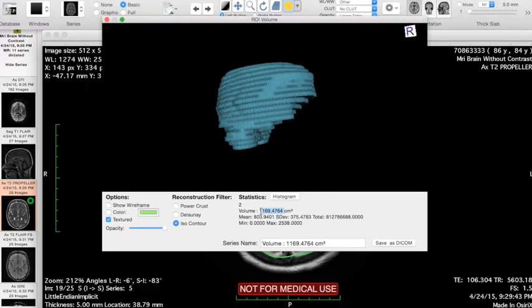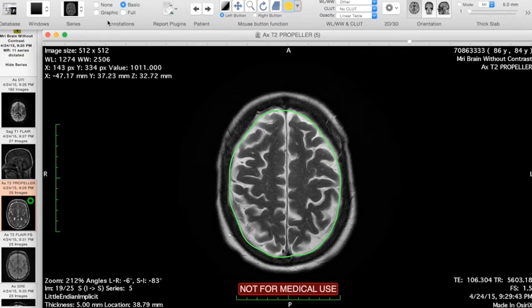and we did the exact same thing for the post-drug MRI. So what I'm now going to show you, though, is how we decided to standardize these values. So we chose the CSF, and more specifically the CSF found within the ventricles, as it's the clearest source of CSF and also the least likely to be contaminated.